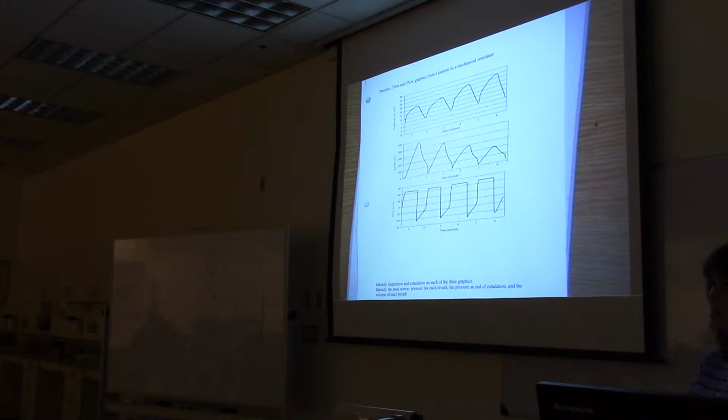All right, what about the second one? Second one is like 25. Okay, centimeters of water. The third one? About 30, 32, 33. Okay, maybe like 31 centimeters of water. And then the last one? 34. 34 centimeters of water. Good.